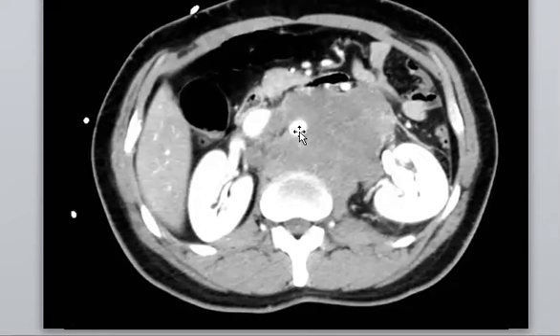But in the, yes, and also floating aorta sign, nice. So Rihan, the displacement is very important, that helps you to differentiate between this and this. So in this case, as we know, in the staging of lymphoma, when you find the retroperitoneal lymphadenopathy, maybe it is metastatic and maybe it's lymphoma.